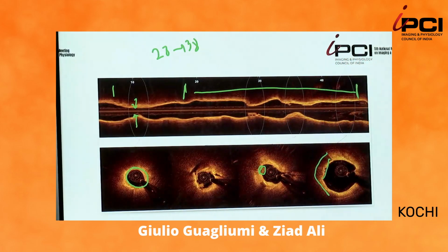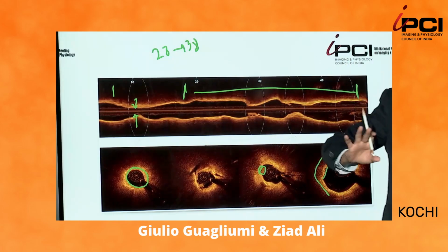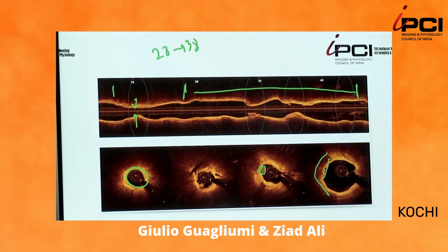So that's the practical interpretation. Now, if this was 32 millimeters away, you would need to think about it in a completely different light. But practical interventional PCI is to cover lesions in the reference segment that have less than 4.5 millimeters squared area.